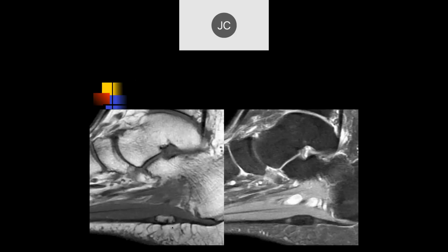chronic injury again. Yeah. So as we've talked about before, there are many areas of the body where we can see ossicles develop within tendons and ligaments. The common ones would be the peroneus longus tendon on the lateral side of the foot. We commonly will see it in the ulnar collateral ligament at the elbow, where about 15% of Major League Baseball pitchers will have an ossicle within the ulnar collateral ligament.